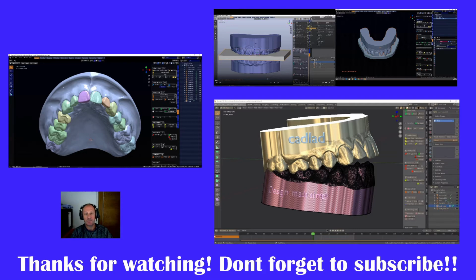This one runs along the same sort of lines, only this one we're going to import an upper and a lower in occlusion. We're going to align the scans, trim them, put a base on them, and then work through the hollowing feature and just show you guys what sort of hollowing options we've got and how that all works.